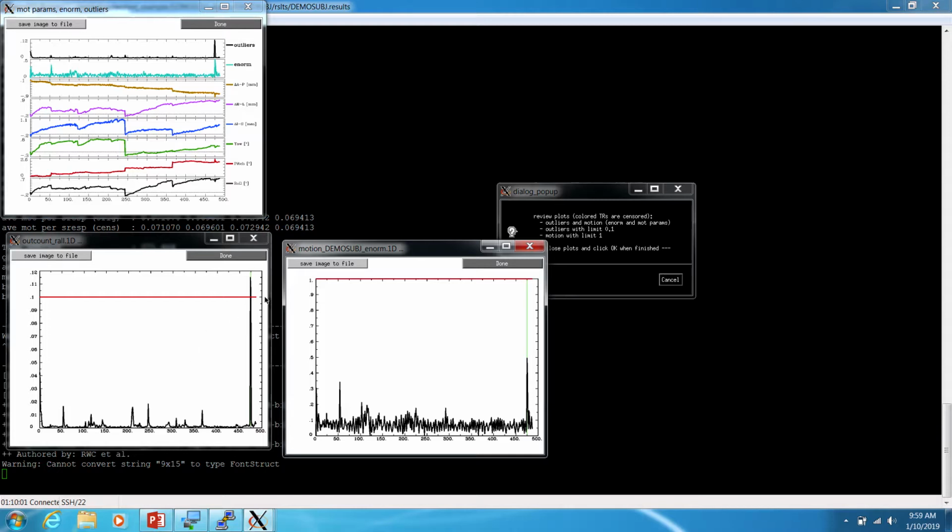In looking at these two graphs, that's what we're hoping for, because when you move, you tend to get signal spikes, and they're highly associated with each other.